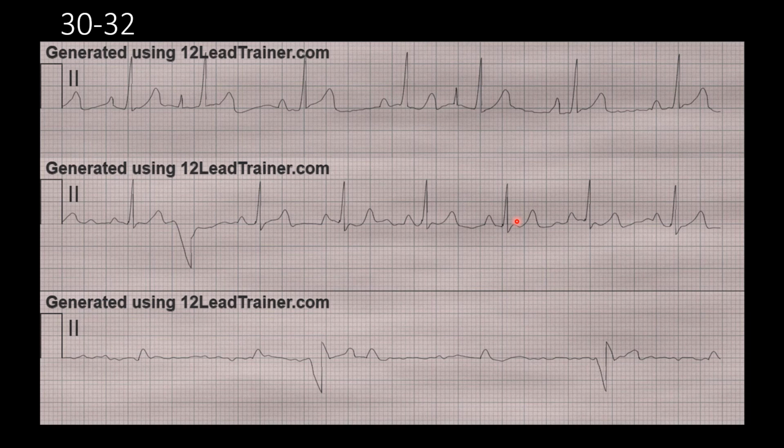We do have P waves. There's one before every QRS with no missing or extra ones. And they look fairly monomorphic or unifocal, so same pacemaker. Our PRI is about 0.16 seconds, and our QRS is about 0.08 seconds. And then there's also some artifact, just like in the one on the previous slide. So with that information, we could call this a normal sinus with a premature ventricular complex, because we have this wide complex that's going in a different direction from the rest of these. So that's a PVC, premature ventricular complex. The rest of the rhythm, normal sinus.